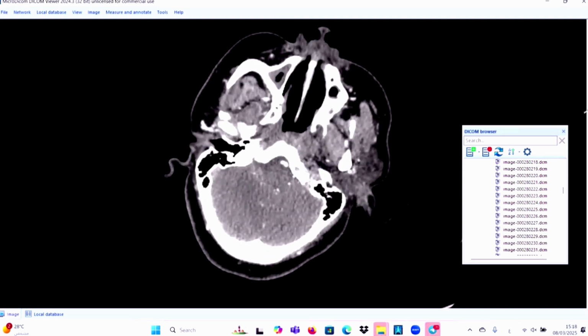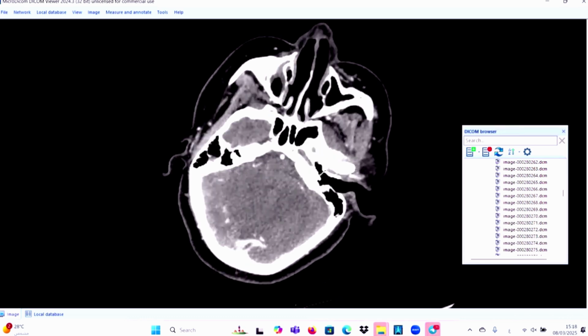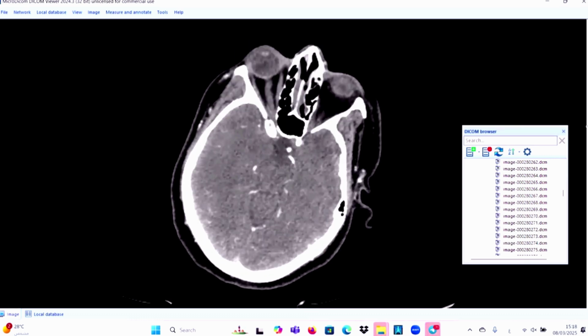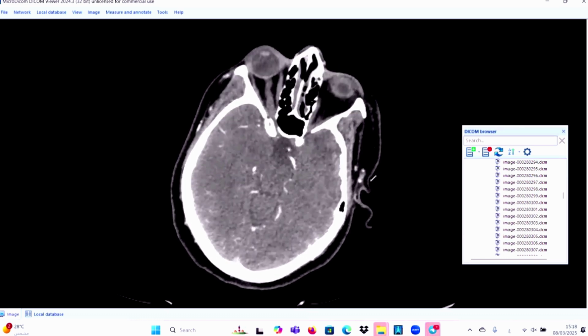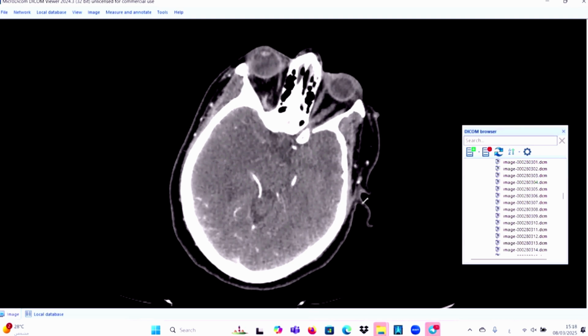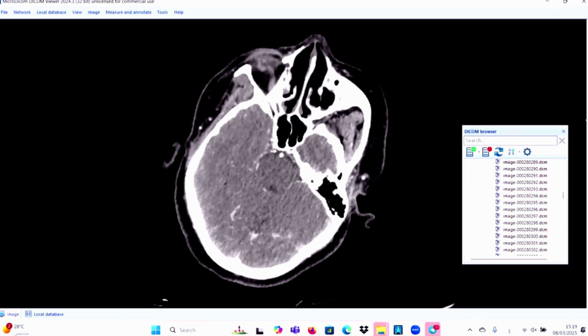They unite together to form the basilar artery. This is the basilar artery. It's patent, showing average caliber without any occluded segments or significant stenotic lesions. Here the basilar artery divides into the posterior cerebral arteries on both sides. So we reviewed the posterior circulation, and we don't have any significant abnormalities.